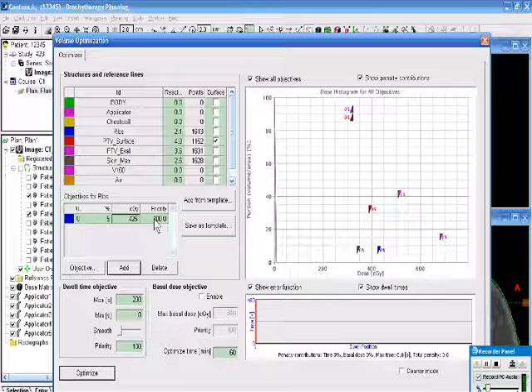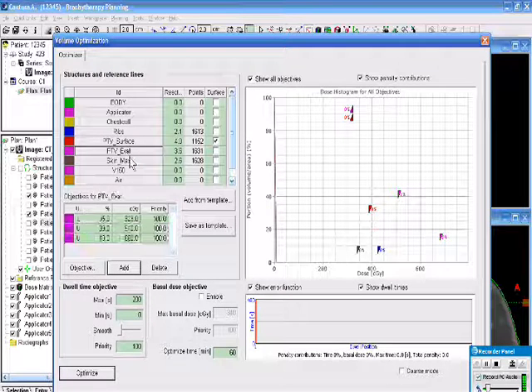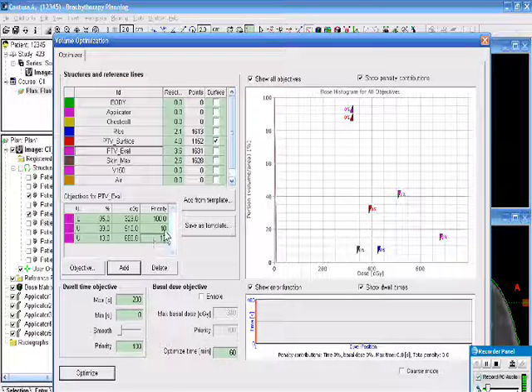So since we're not really using them, I'm going to set their priorities to be quite low. I'll set 10% on the ribs. The skin max I'll set likewise at about 10%. The V150 and the V200, I can set those also at 10%. And then we'll just see what we get. Now, if these become an issue, we can increase their priorities.